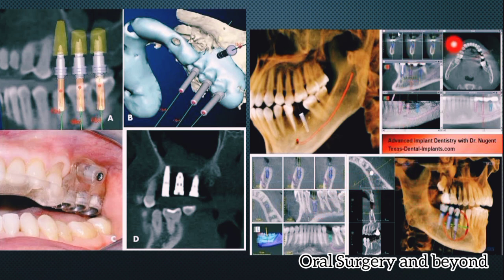For that we have to see all the axial, coronal and sagittal sections, and we have to identify the exact implant selection for the particular case, right? We will see in detail an actual software workout in my subsequent CBCT cases.